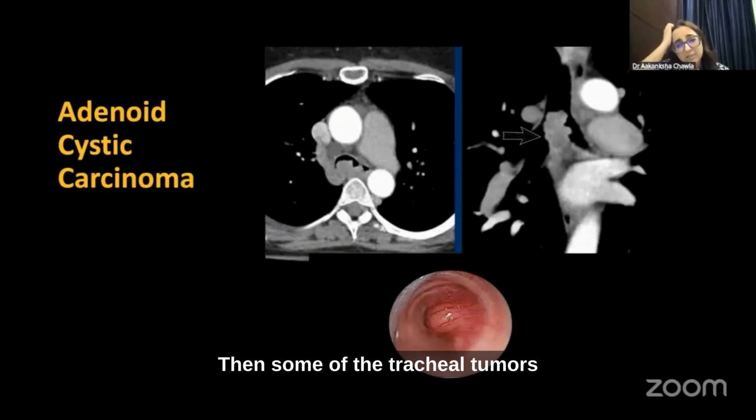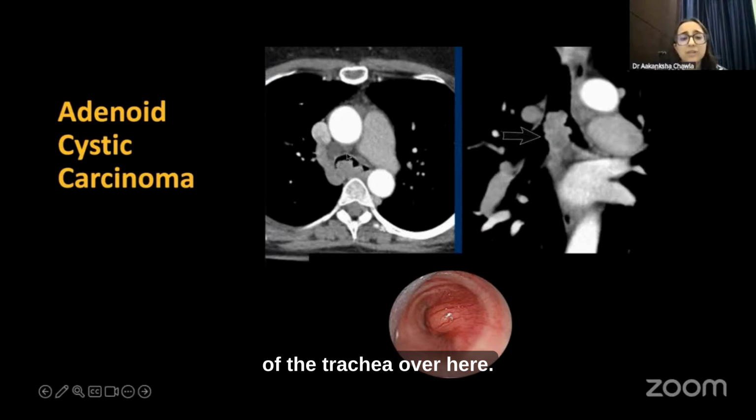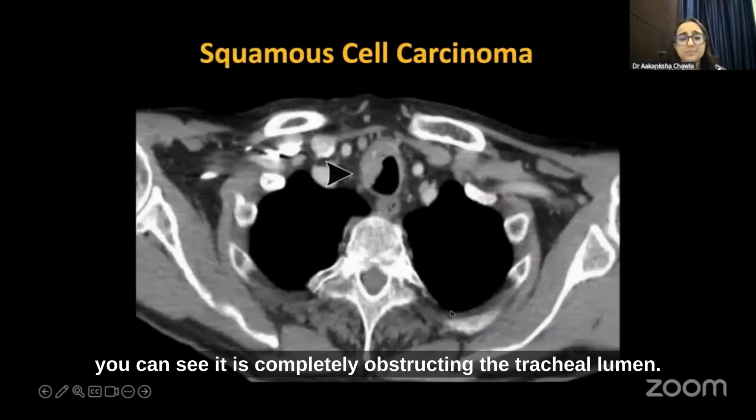Then some of the tracheal tumors, like the adenoid cystic carcinoma, as you can see, it is obstructing the lumen of the trachea over here. You can see the mass lesion also over here. And when you look at the bronchoscopic view, you can see it is completely obstructing the tracheal lumen.